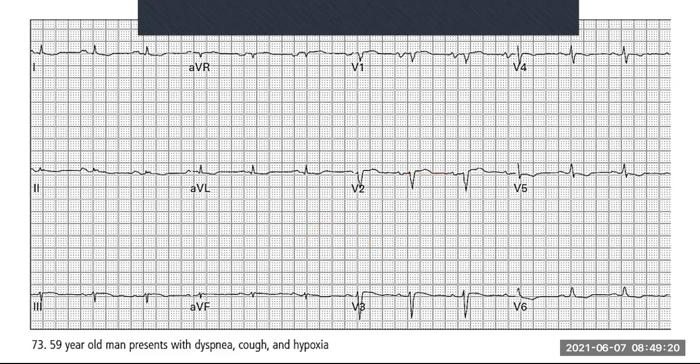All right, so the question you may ask is why in V1? V1 sits here. All right, so V1 looks at the right atrium and then looks through to the left atrium as well. So what it's doing is it's seeing this right atrium that's right in front of it, giving it a little boost. And then it sees the left atrium is kind of facing the other way, it's more towards the back. And it's suddenly giving out this large amount of negative electrical activity.